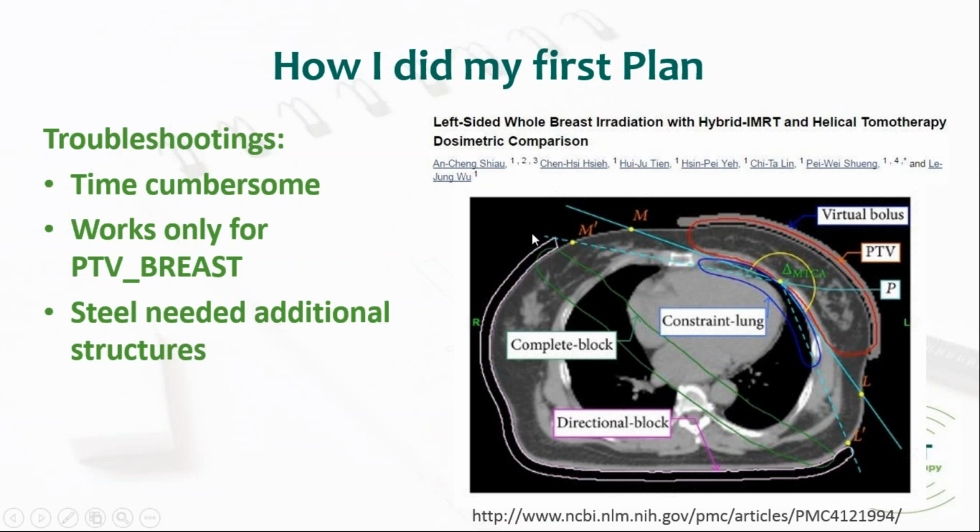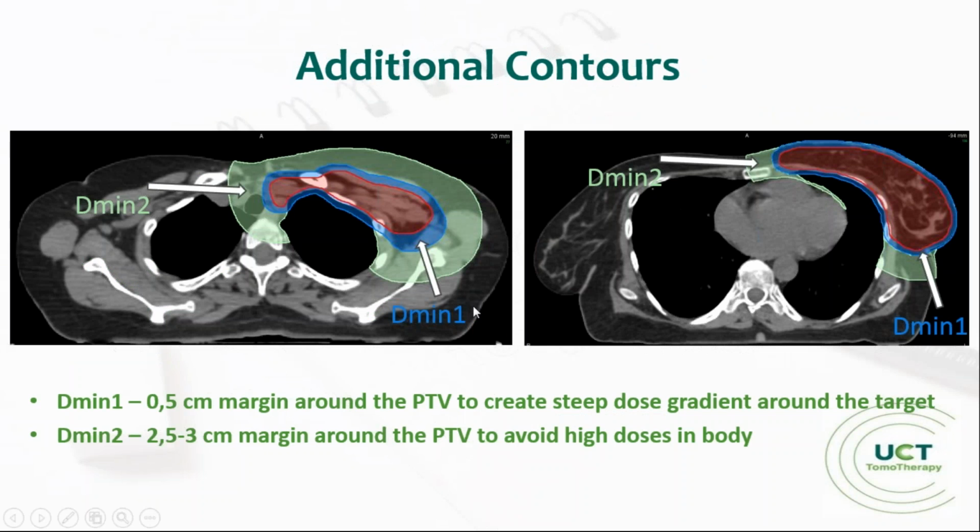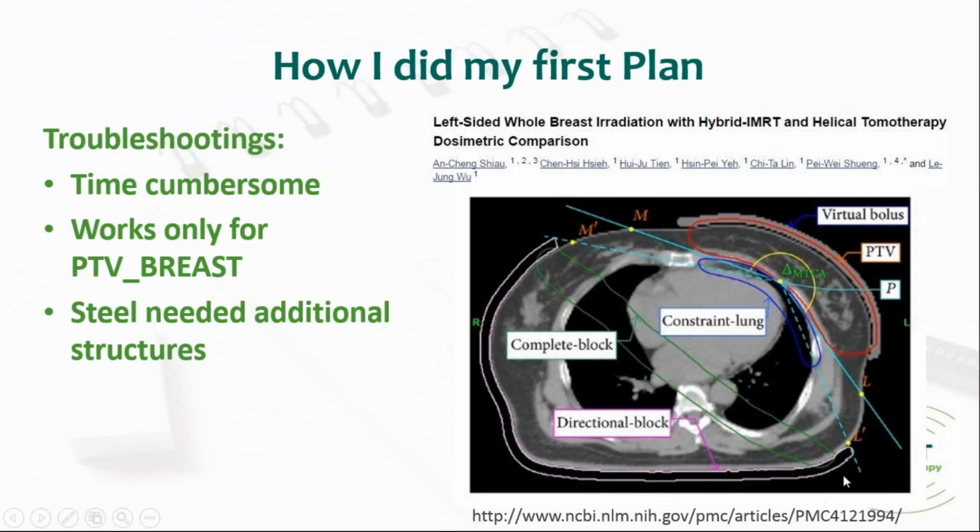This will prohibit all beams from this side from going through the right side of the body.